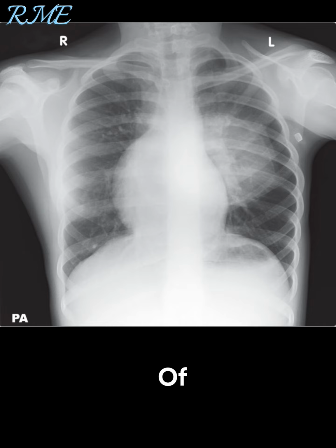The fact that the borders of the mediastinal structures remain clearly visible suggests that the large density is not in contact with these structures, and accordingly may not be intrathoracic. The chest wall anomalies are likely to explain the mediastinal shift, although it is possible that the large density contributes anteriorly. The combination of left-sided chest wall deformity, metallic density in the left axilla, and a large left-sided opacity suggests this is a surgical implant, most likely pectoral, with an underlying diagnosis of Poland syndrome.